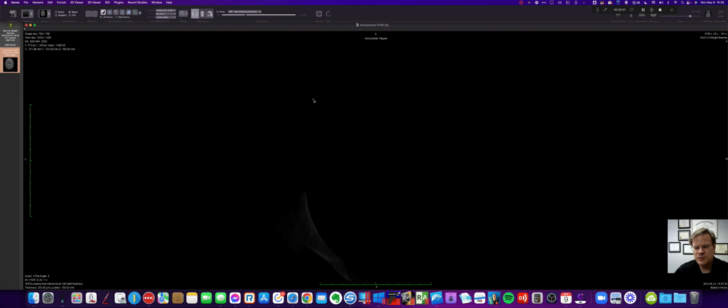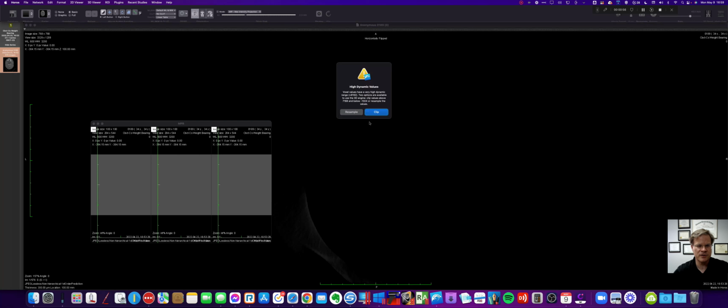You don't need to do this, but if you're going to be sending images to another chiropractor, you probably want to, just to make sure that the left and the right are on the reading left and the reading right, as is typical for chiropractic views. Now, what we're going to do is come up here and hit 3D MPR. If you do this after you horizontally flip, then when you get the three images, you'll have to flip each one individually. So this way it'll do all of it.